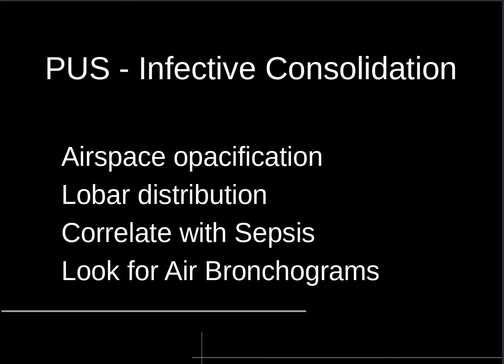Pulmonary edema affects all lobes. Correlate clinically. If the patient is septic and there's an airspace opacification, it's probably infection. Repeat the chest x-ray after appropriate antibiotic treatment, and you should see a resolution. And look for air bronchograms.